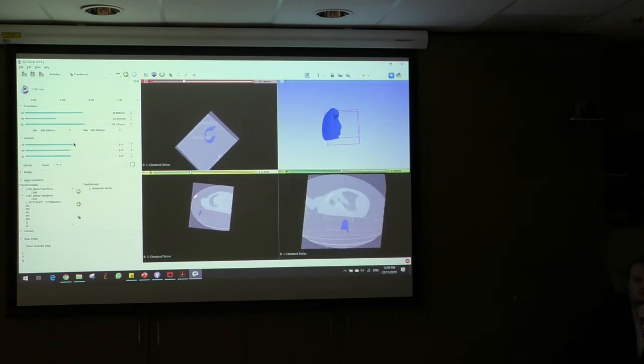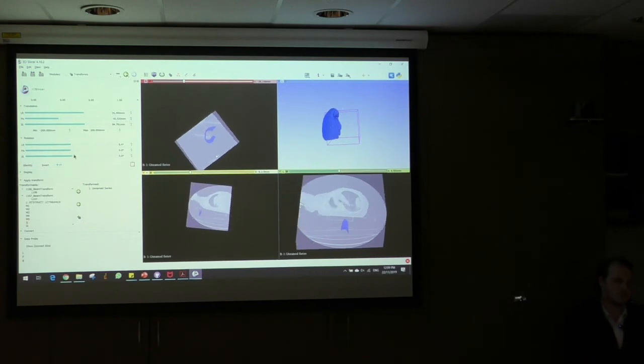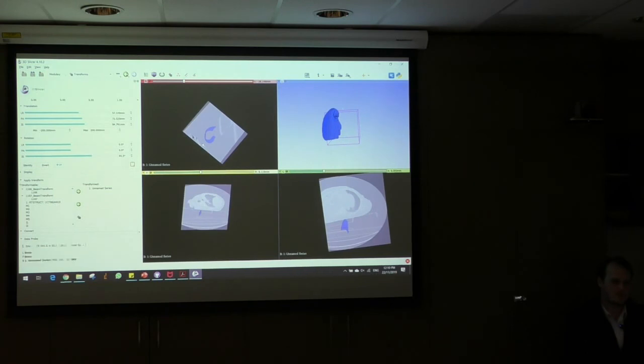So we're not limited to just the 2D slices. We can actually change the view. If we have the scan of our patient going through like so, we are able to shift it this way and actually see the information from a diagonal method, which is very different to what you would experience in treatment planning software. It's an additional feature. When we scroll through, we're looking at information in a diagonal plane, which I don't know if anyone's ever done before. Very cool. So you've got additional options there.